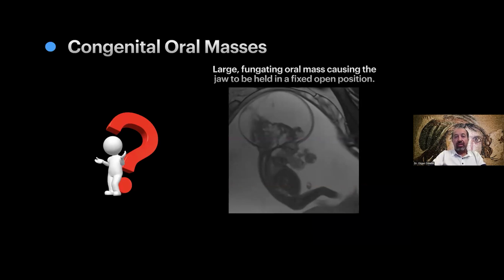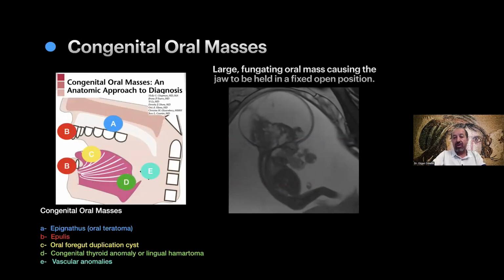a multilobulated, huge mass, with both solid and cystic compartments, including both the intracranial part and the oral part. Although congenital oral masses are rare and can readily be detected during fetal ultrasound screening, fetal MRI follow-up always gives us a more specific diagnosis by applying a strong, straightforward anatomic approach.